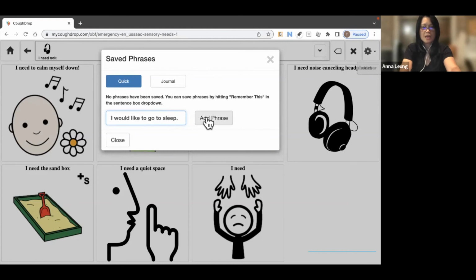Then I hit add phrase, and add one more. Once I add it, I hit add phrase again.